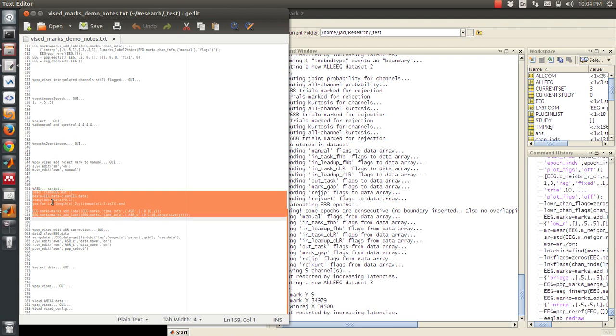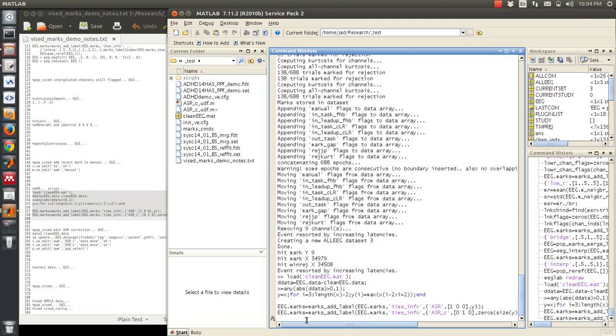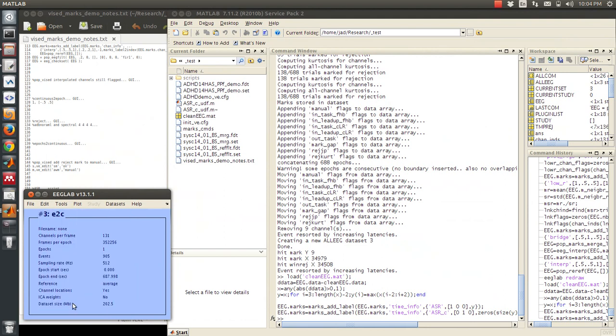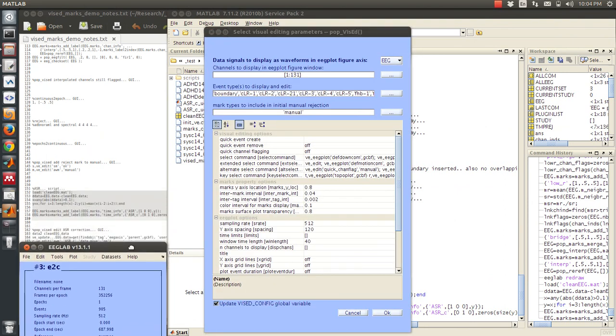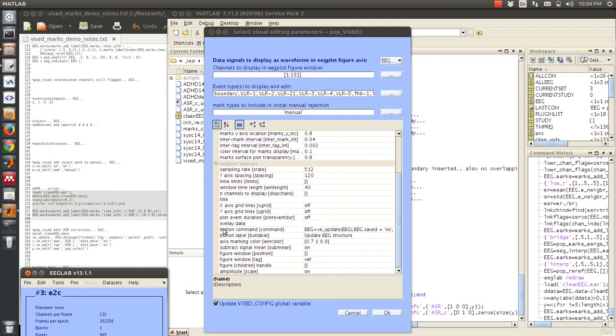And I'll plot it with some new properties that allow us to interact with the difference between those two data sets. So I'm going to copy this. This will compare the two data sets and build the marks. And now I'm going to rebuild this plot. And now that I've loaded the clean data that was generated, I'm going to plot as the overlaid data clean EEG dot data.